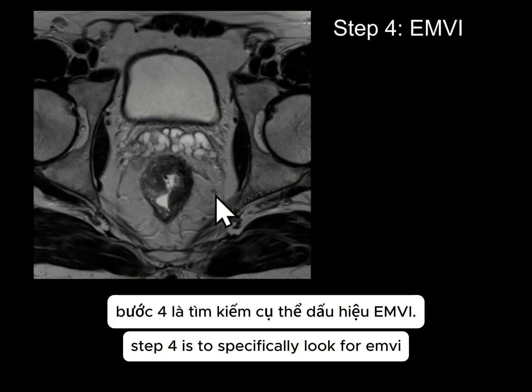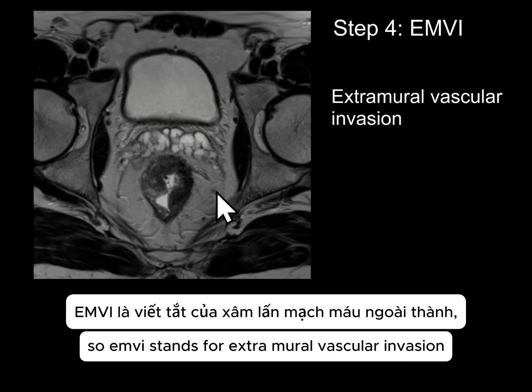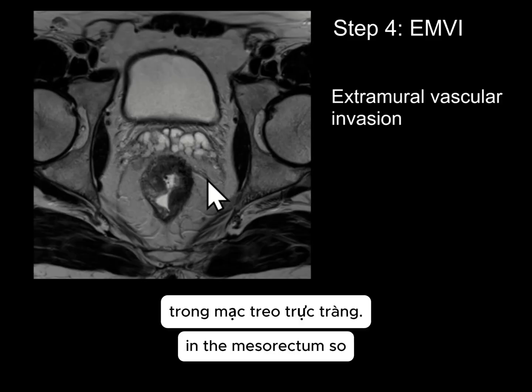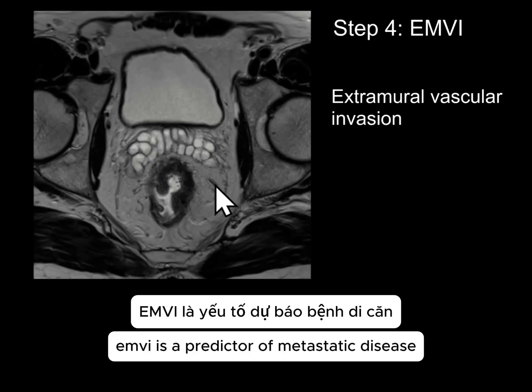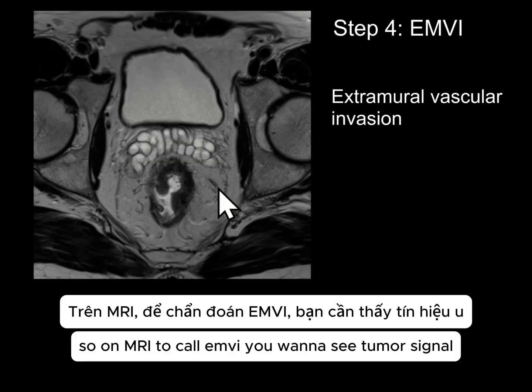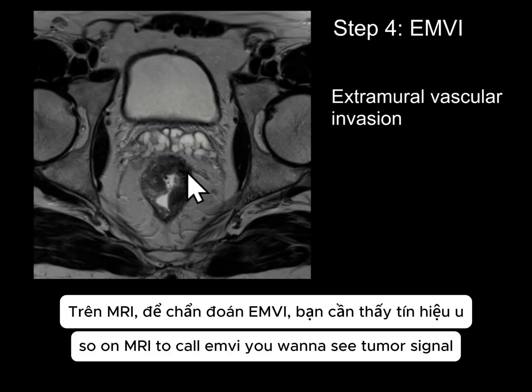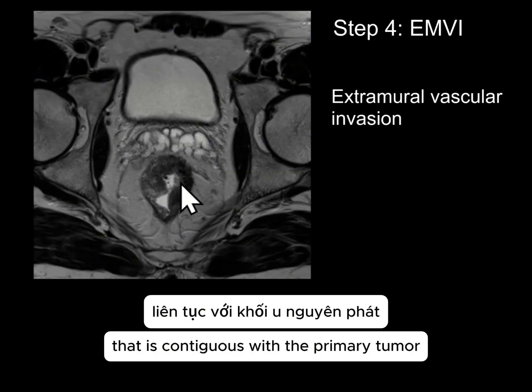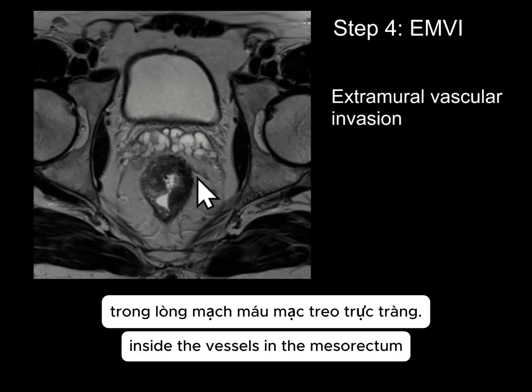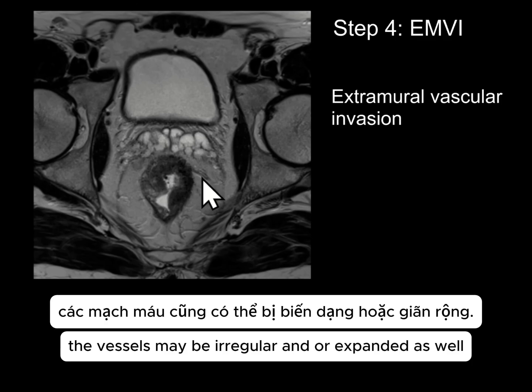Step 4 is to specifically look for EMVI. EMVI stands for extramural vascular invasion and refers to tumor extending into the vessels in the mesorectum. EMVI is a predictor of metastatic disease and is a poor prognostic factor. So on MRI, to call EMVI, you want to see tumor signal that is contiguous with the primary tumor inside the vessels in the mesorectum. The vessels may be irregular and/or expanded as well.